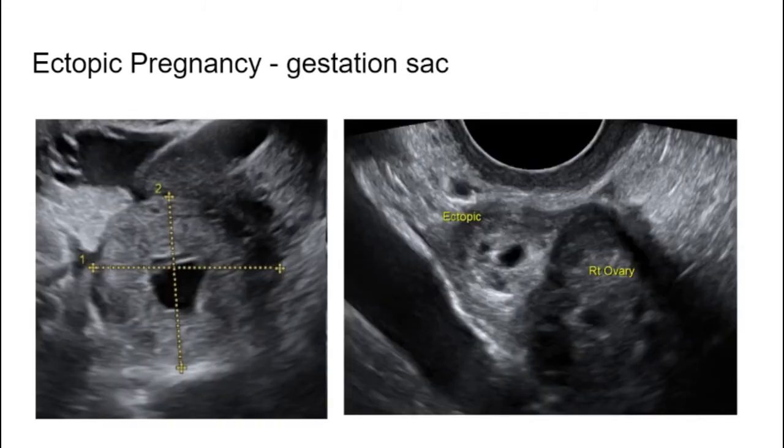These ones are much more obvious. So you've got gestation sacs. You can actually imagine it, we call it a bagel sign or a donut sign. So you're looking at the tube end on as if it was cut into slices. And you've got the pregnancy gestation sac within the tube and then the dilated tube around the outside. So you've got these gestation sac or bagel sign ectopics.